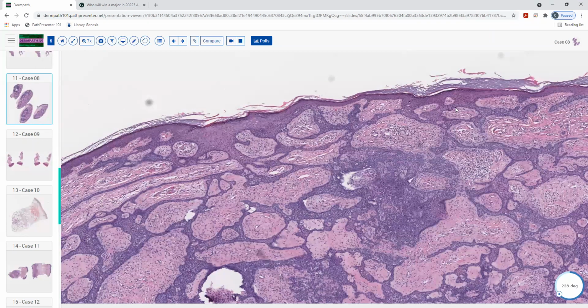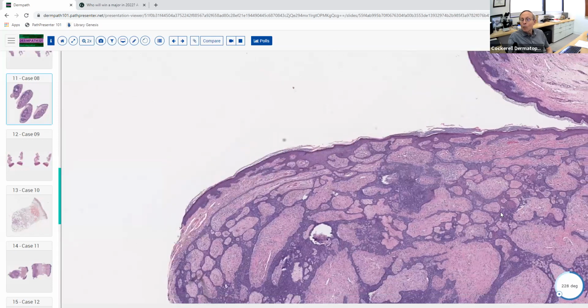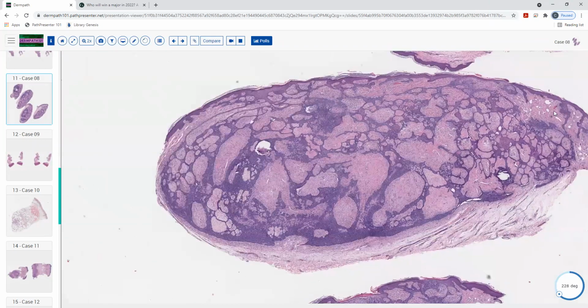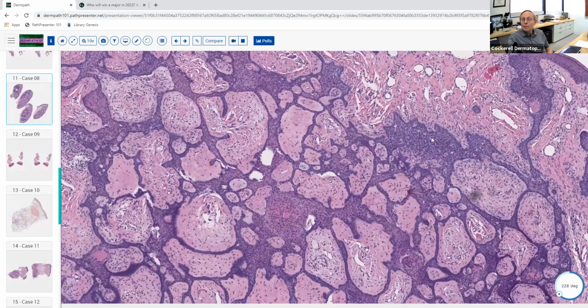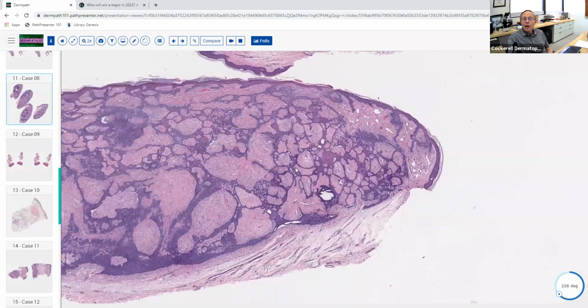So sometimes they can form a tumor, like you see here. This entity, some people think actually is a quote mantleoma, if you will. So it shows these basaloid cells, and they are differentiating towards the follicle. This is primitive follicular epithelium. So what's the diagnosis here?